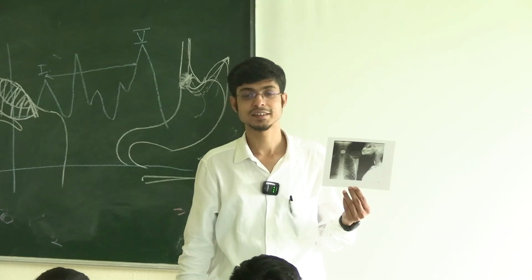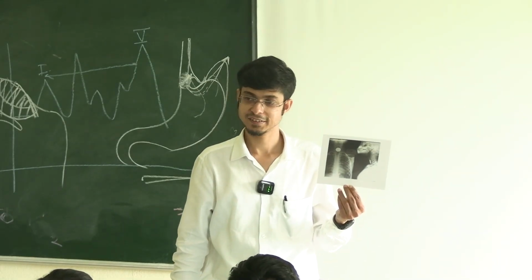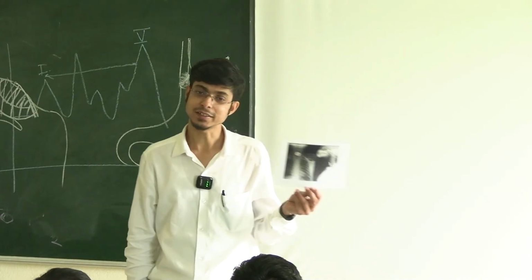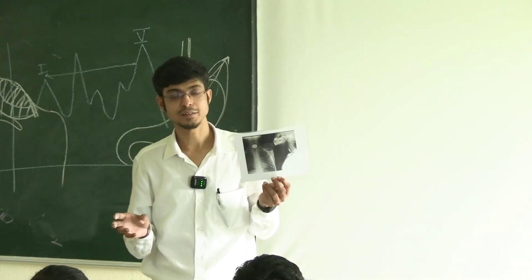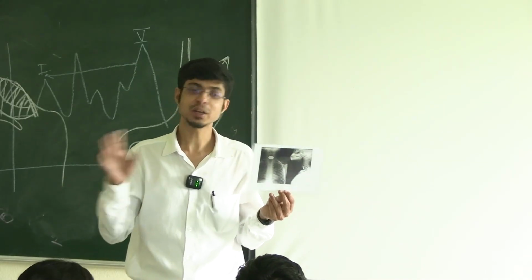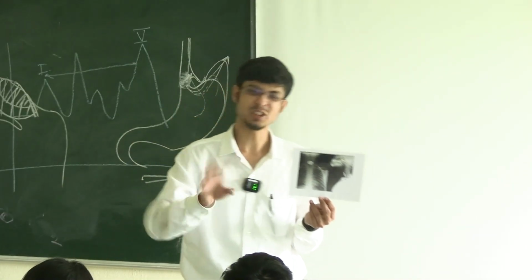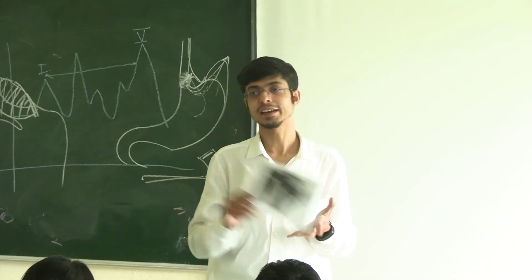Slit-like. Coin will not be. It can be anything. You say a radiopaque circular foreign body. Okay, a flat circular foreign body. Probably a coin. You can add probably a coin, but don't say coin directly. Okay.